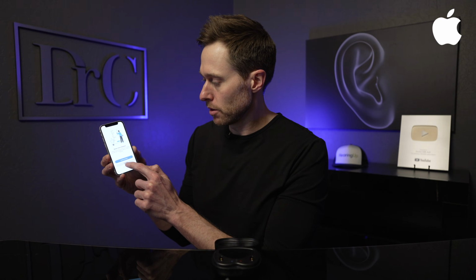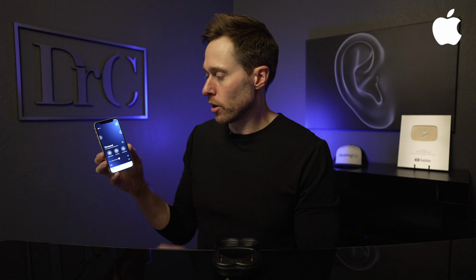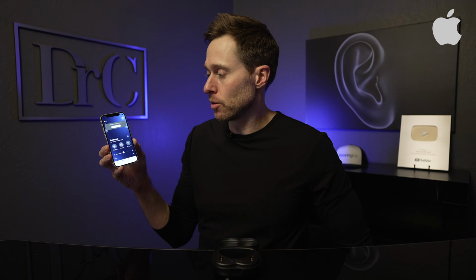We're going to accept everything. We're going to skip that, searching for the hearing aids. And there we go. Just as simple as that. Click on got it. We are now connected with the Apple device. All right, now that we have our Starkey hearing aids connected with our smart device, let me go ahead and show you what you can do inside of the app.